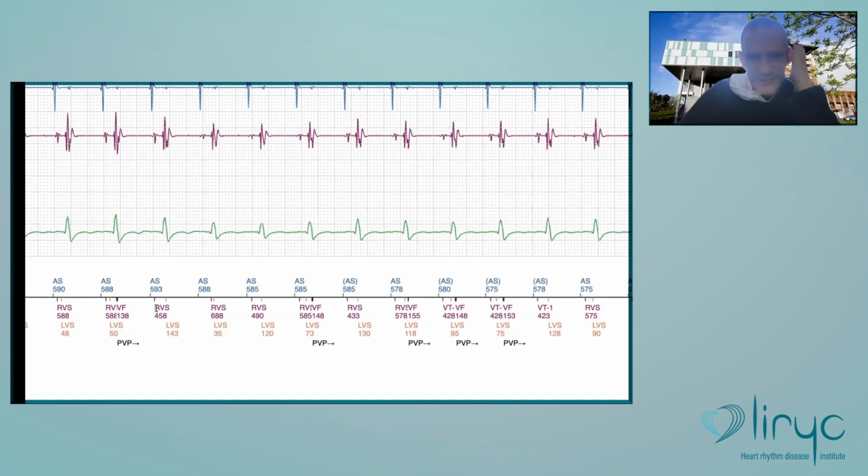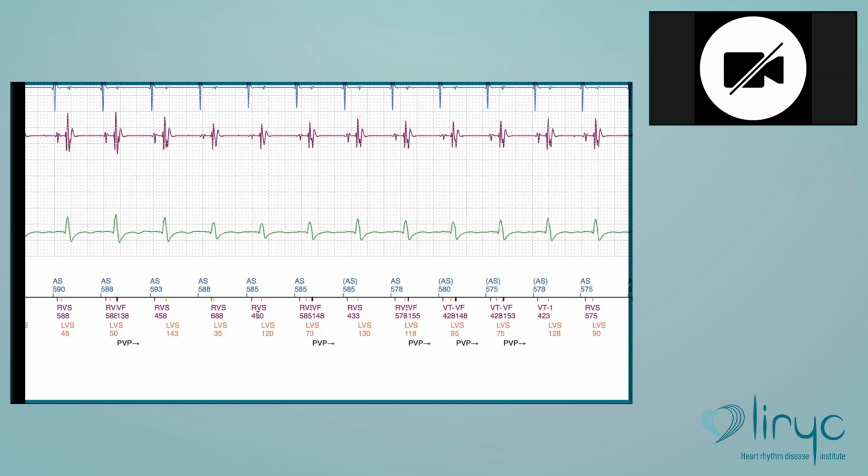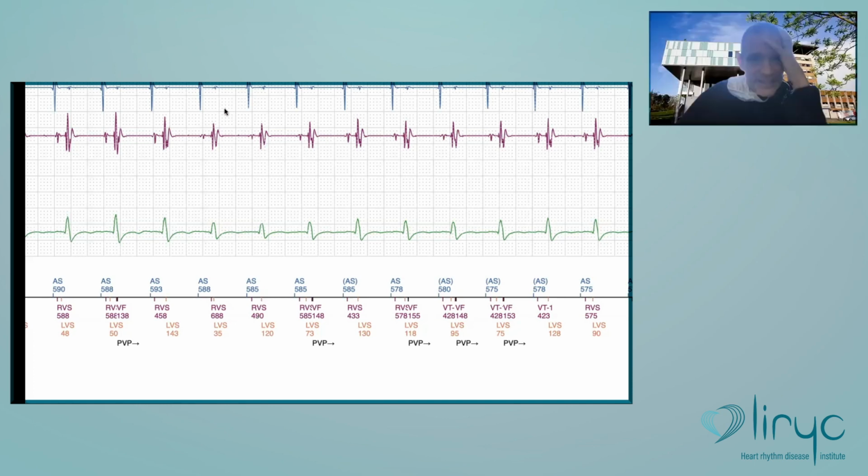That's something which is fixed. So you will never see signals faster than 135. That's impossible in the right ventricle. Okay. This is the limit for the detection. But here clearly you see oversensing of the atrial activity. Are you surprised that it happens in a Boston Scientific device?